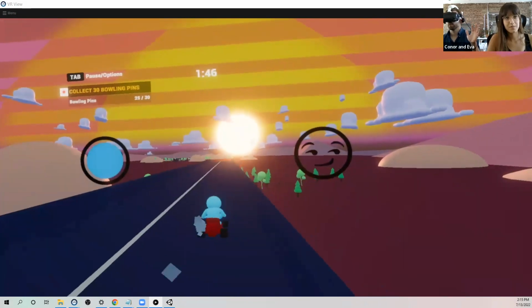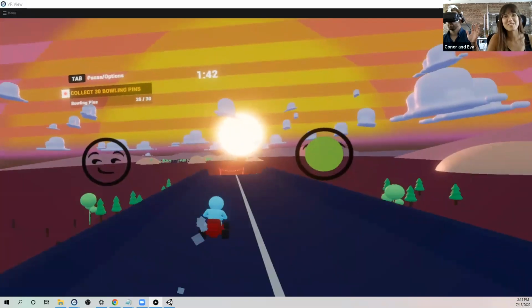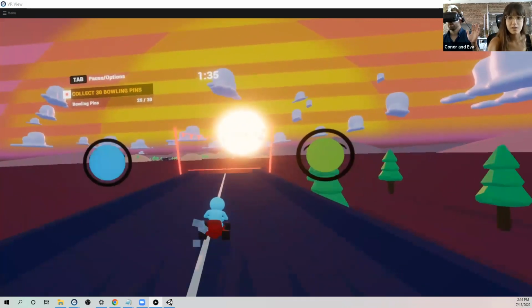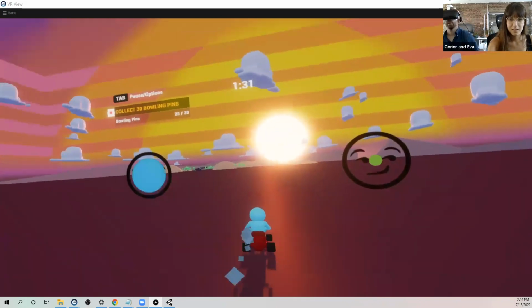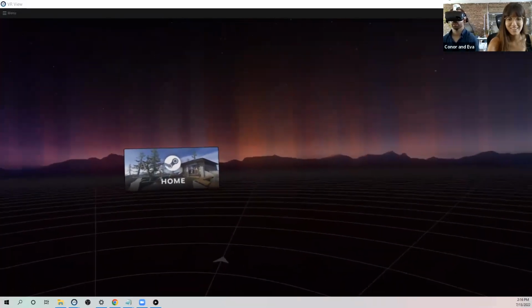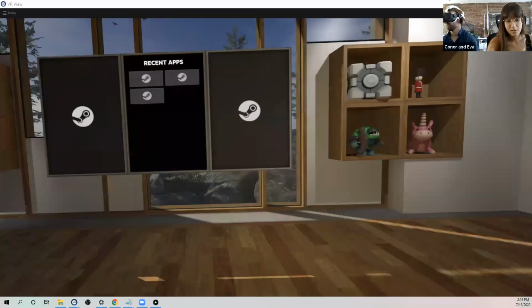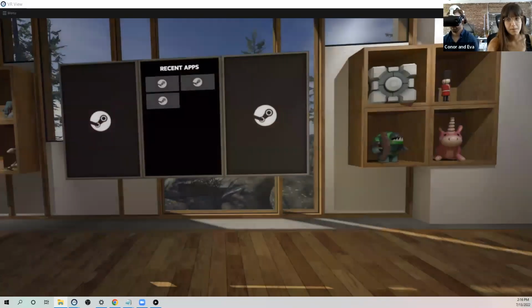Oh, missed those ones. I think you needed to collect 30, but you only collected 25. I can start it again for you. I didn't collect enough pins to win. So the goal is to collect 30 pins. All right, let's try that again. Let me launch it again. I was moving too fast.